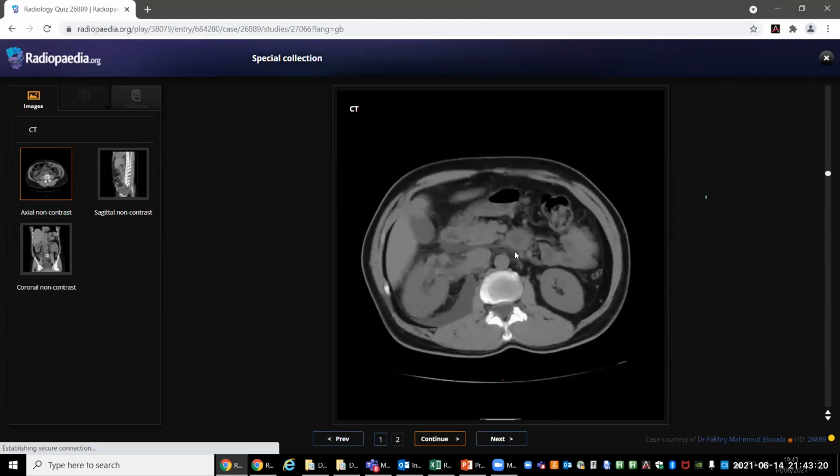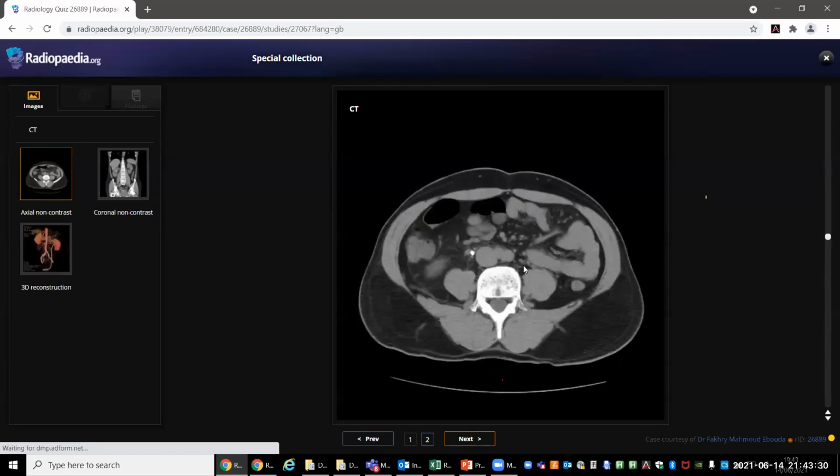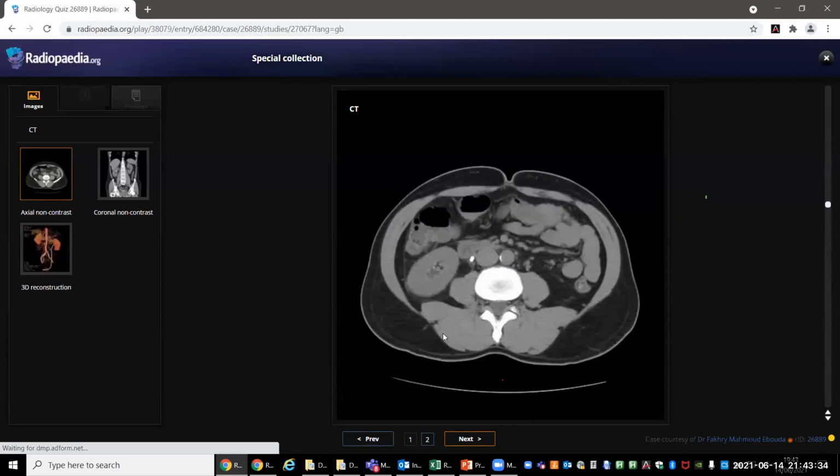And you said the right things. You would do CT with contrast and delayed phases to confirm your diagnosis. I just did not show you because you said all the right things. This was even post intervention, anyway. But yes, you're right. The post-contrast scan will show the urinoma better, with contrast within it.